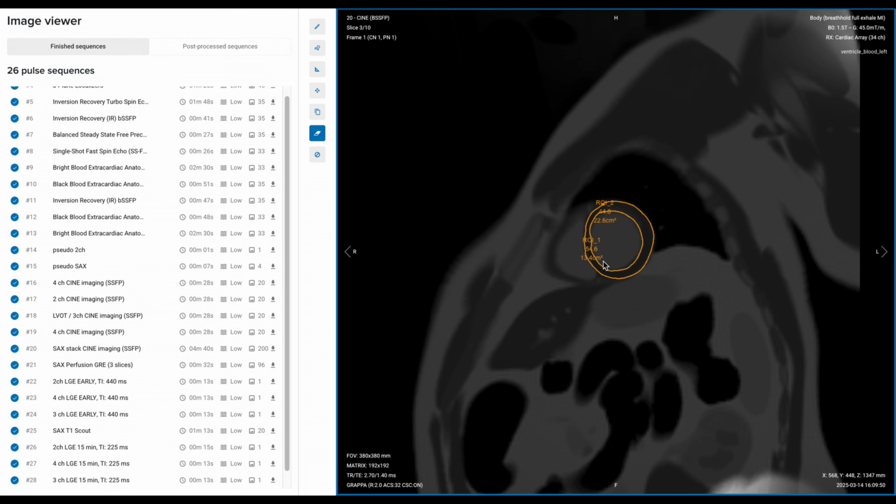They compare the endocardial border during systole and diastole. The volume difference of the endocardial cavity between systole and diastole gives us the ejection fraction, or EF. That's the single most important number to assess heart function. But when we're talking about viability or transmurality, we're not just looking at volume.